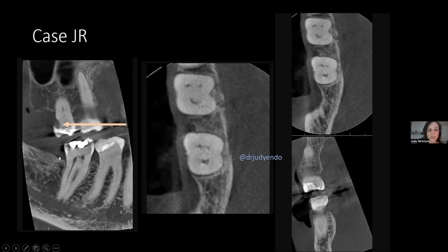So you see horizontal, horizontal, horizontal, horizontal, dip, horizontal, horizontal, horizontal, okay? Again, on the axial, bone, bone, bone, bone, Mickey Mouse ear black, bone, bone, bone, all right? So that corresponds exactly to the same location in all of the planes.